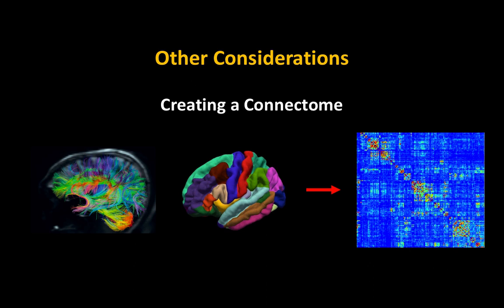But this tract gen is probably complete at this point. No, it's not. Okay. Takes a while.